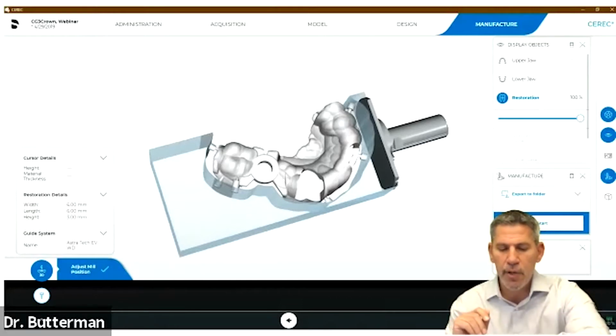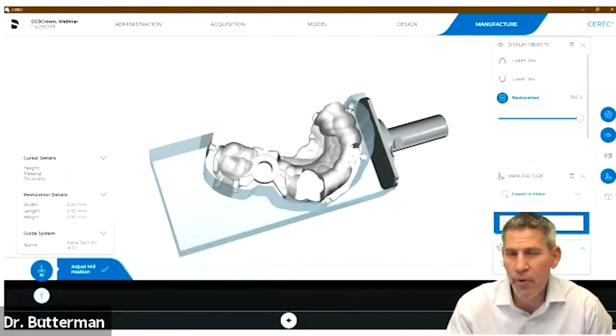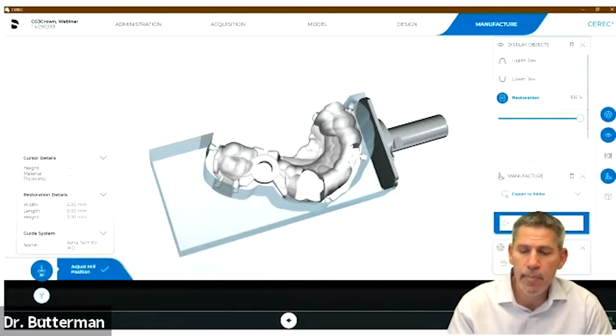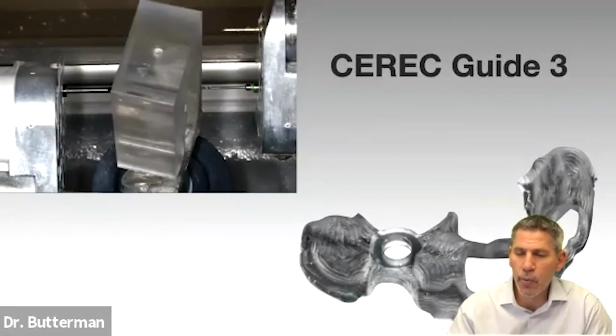How are we in our webinar? We're about 30 minutes into it, and I've done a lot of other talking. When I do that live in front of the patient with no talking, the entire design process and the milling of the guide is somewhere around 45 minutes. So you can do same-day guided surgery if you want. I don't often do same-day guided surgery because we have to deal with schedules and financing, but you absolutely can, which is nice. So we've got our designed guide, and now we're going to set up that block and manufacture the CEREC Guide 3.